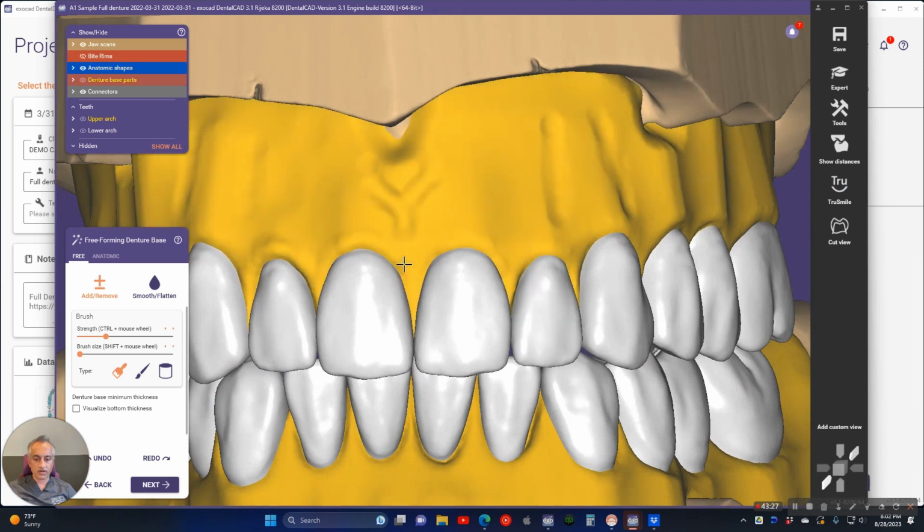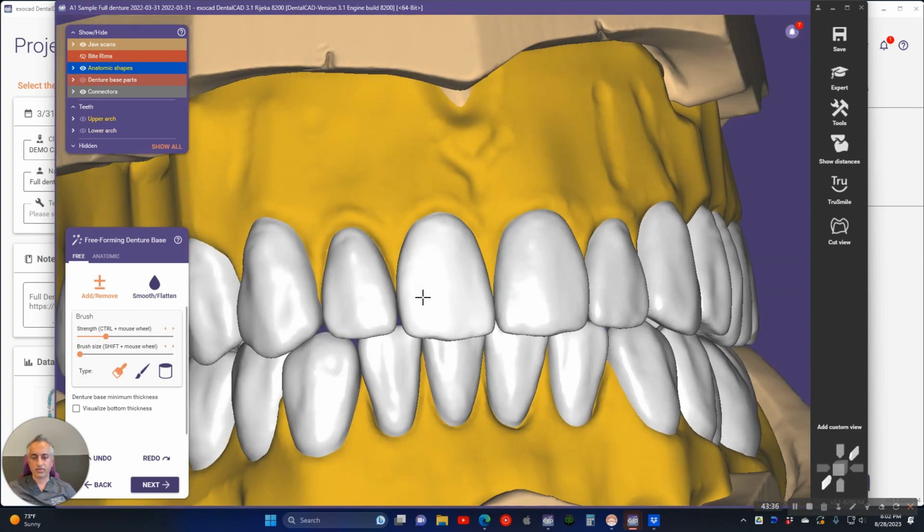This is a good time to go ahead and tweak this to whatever aesthetics you want here, because this is all strictly aesthetic. I mean, there's probably some functional portion of food escapement, but it's mostly aesthetic.